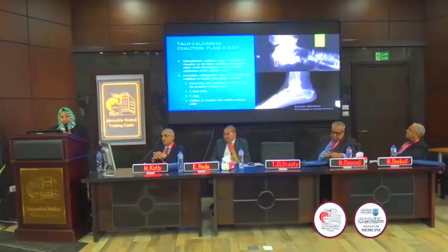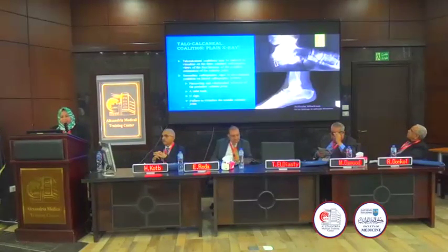I will start with the talocalcaneal coalition. Unfortunately, plain X-ray may have difficulty visualizing the coalition site because of the oblique orientation of the tarsal bones and the complex orientation of the subtalar joint, but we depend on secondary radiographic signs to suggest the possibility of talocalcaneal coalition, such as narrowing of the posterior subtalar joint and related subchondral sclerosis, the presence of a talar beak on the dorsal aspect of the talar head, the complete C sign, and failure to visualize the middle subtalar joint on the lateral view.